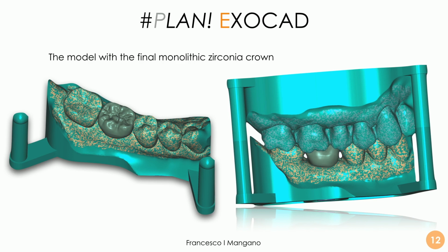And then you can eventually check everything for the final monolithic zirconia crown, with a model if the dental technician needs a model. Technically, we prefer to work model-free with all implant-supported restorations if we work monolithic. If we work with monolithic crowns or monolithic bridges, we skip this step of the models because it saves time, and also it saves money because you avoid printing the model.